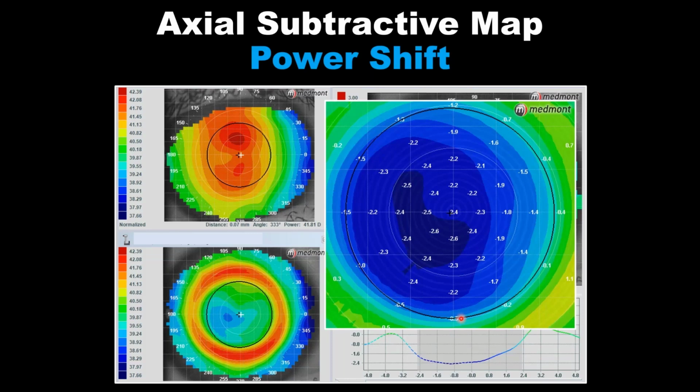So this patient is getting a bit of plus, but I would prefer to see a smaller treatment area and a bigger power spread. That gives me more confidence that we're pushing lots of plus and slowing down that eye growth. Now, if this were adult ortho-K, we'd be super happy with this. The blue treatment zone is extending past the pupil 360 degrees. This is an excellent outcome for an adult, or at least we would expect it to be.